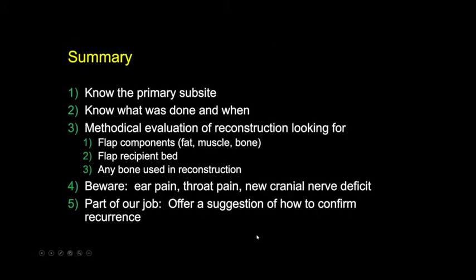In summary, these are tough cases. And it's a bit easier if you can spend some time and know the primary subsite. You may be able to tell it just by looking at the scan. Know what was done and when. So know that you're outside that time frame of when you have post-surgical swelling. Very methodically, look at the reconstruction. Decide what are the components. Is it fat, muscle, or bone, or all three?